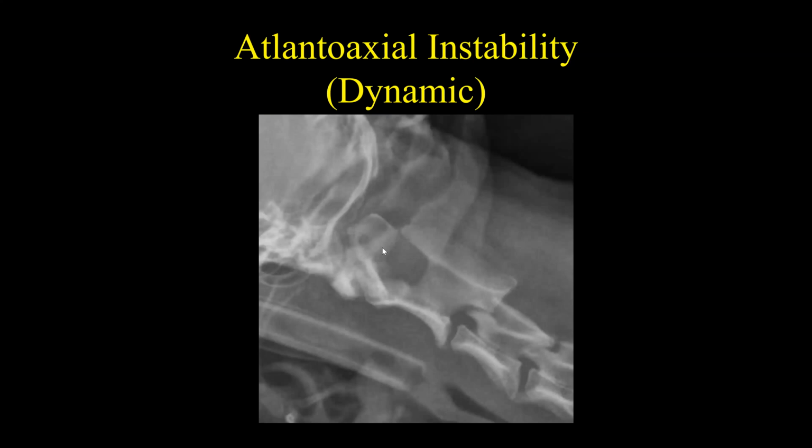So here's a dog that, again, has an endotracheal tube. We have a nice straightly positioned radiograph centered over C1 and C2, which is what we want. And this one here, it's a little questionable on this dog here. Here's that bulbous part of C2 that's kind of weird looking. It extends cranially. Here's C1, and it doesn't really overlap it, but it comes right next to it. So you're going, well, I don't know, maybe, maybe not. Again, you always want to put this in the clinical context with the dog. What kind of clinical signs does he have?